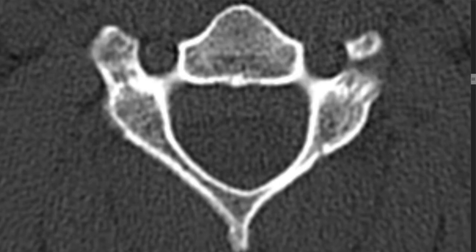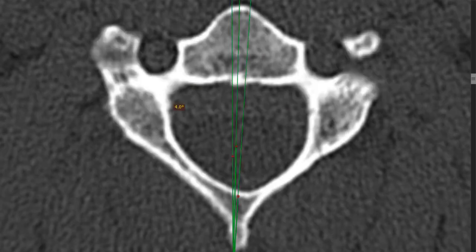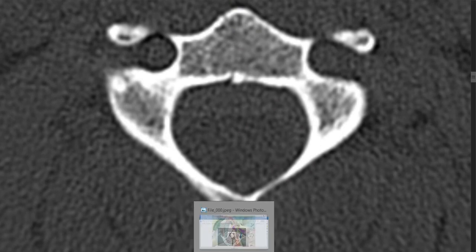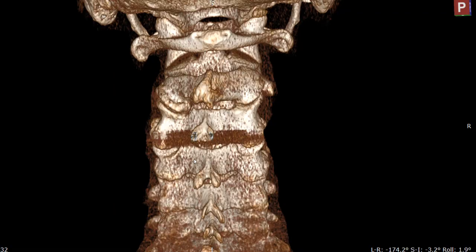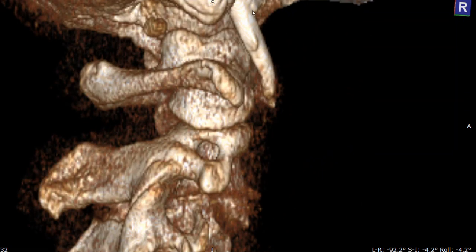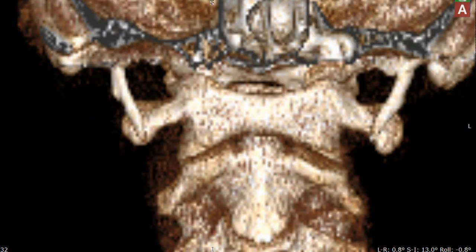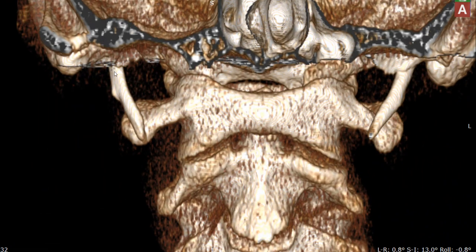So I would look to see if there's that calcification that I saw, and see if there's anything blocking nerve paths, which I don't see. So here's the styloid, as I was mentioning here. You got the jugular vein that comes right through here. Sometimes that jugular vein crimps in the front.